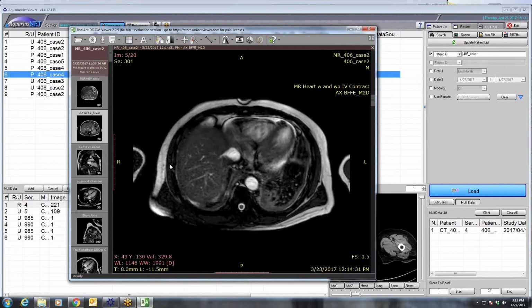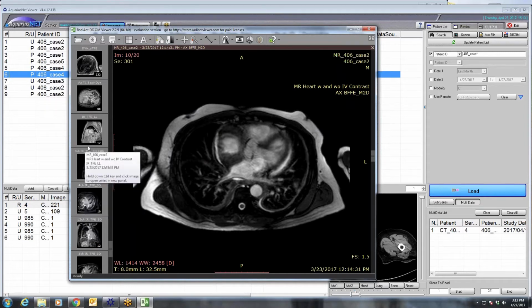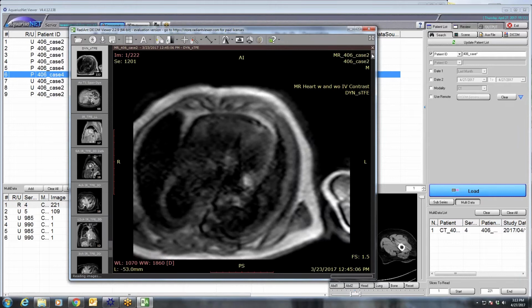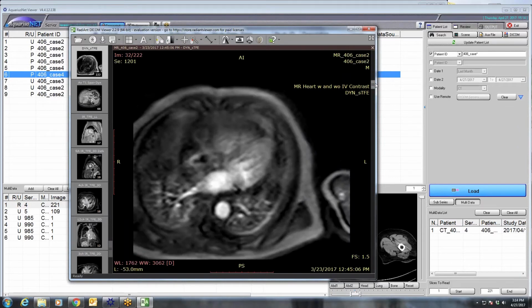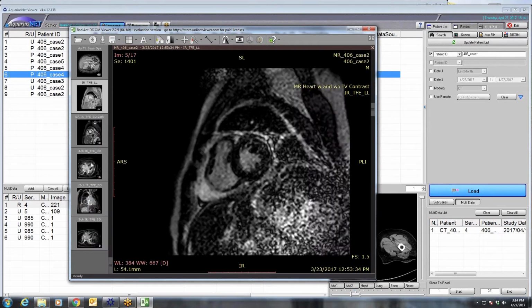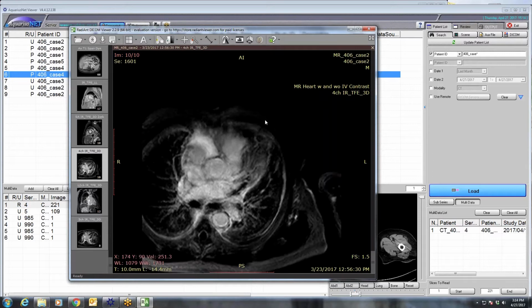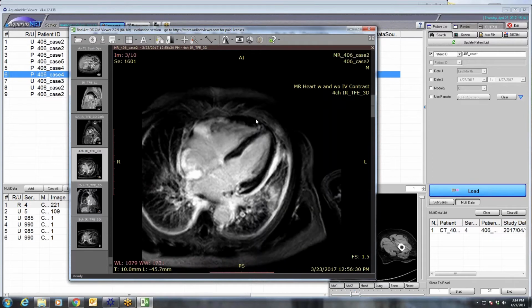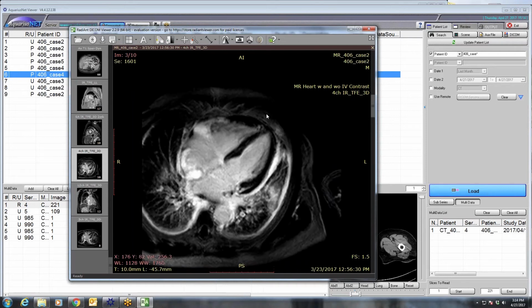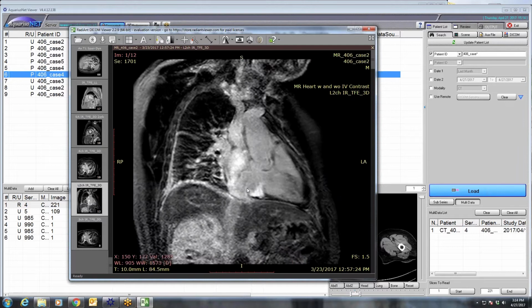and was wondering, trying to put two and two together. And I said, well, maybe let's look. Anyways, this thing actually avidly perfused. This is the post-contrast. So here, I'll show the perfusion. So avidly perfusing. There's unfortunately some wrap. But the T1 posts are very impressive in terms of enhancement. What was most impressive was the delayed. So now I'm like, okay, this is some form of fibrous tissue. What could do this? Pleura, pericardium. So I'm like, let's look and see if we get any views of the kidneys.